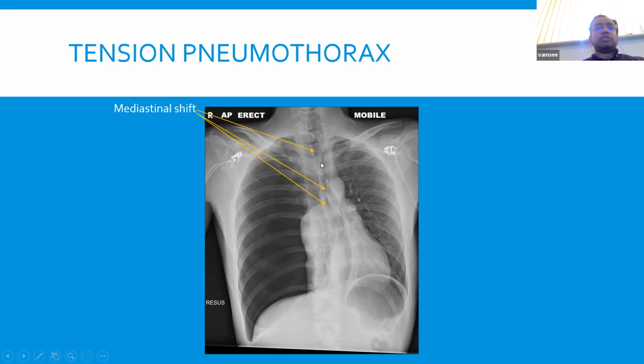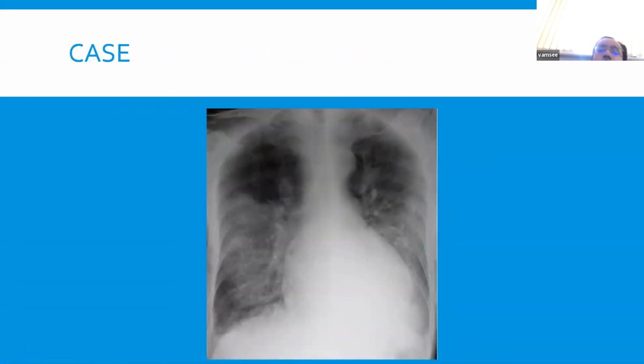It's a favorite in exams. And that's that. It's very good that you asked that about trauma because usually there's a reason for it, and they often have other fractures. As far as I know, this X-ray doesn't have any other abnormality there. Okay, so what do people think is going on here?